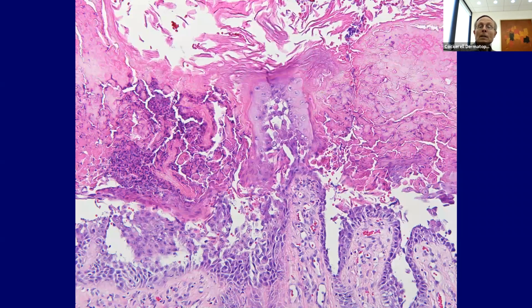So we look here, and there's some dyskeratosis. And the acantholysis is not confined to just the basal cell layer. It goes all the way throughout the epidermis. There's a lot of crusting. There's some purulence. So you can imagine clinically what this would have looked like. And also notice that it's diffuse. It's going through basically most of the biopsy.